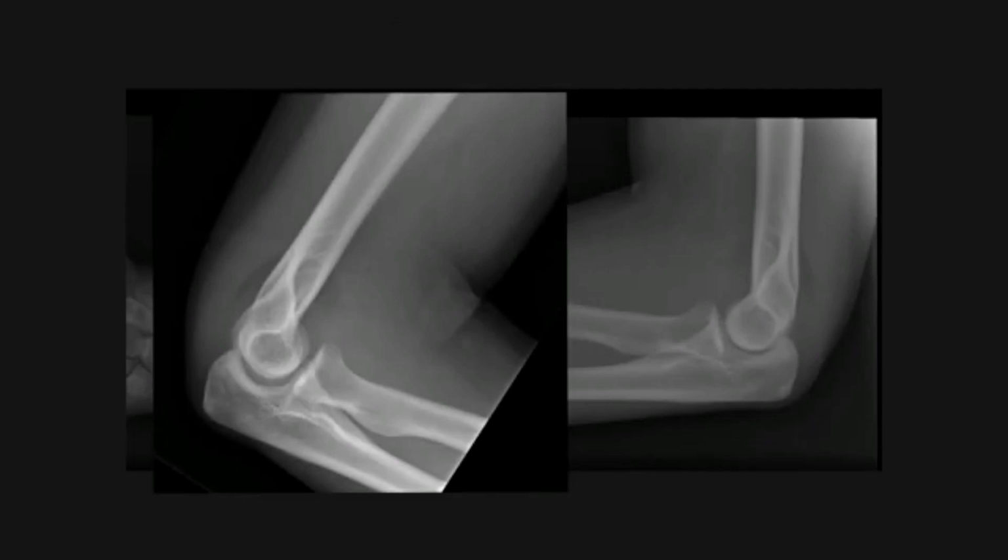Two different examples. This is a patient who has elevation of the anterior fat pad and visibility of the posterior fat pad. It wasn't possible to see a fracture either on this view or on the AP view, but the assumption is made that once a patient who has a history of trauma has an elbow effusion, it's almost certainly caused by a radial head or radial neck fracture. In this particular patient, again you can see the posterior fat pad. The anterior fat pad has now been stripped off the anterior cortex to lie in a more anterior position, and the fracture here is very subtle, but it's just a break in the cortex of the junction of the radial neck and the radial head.